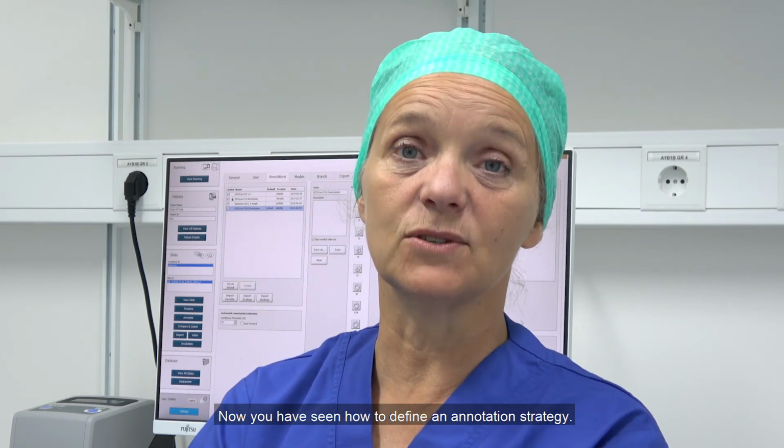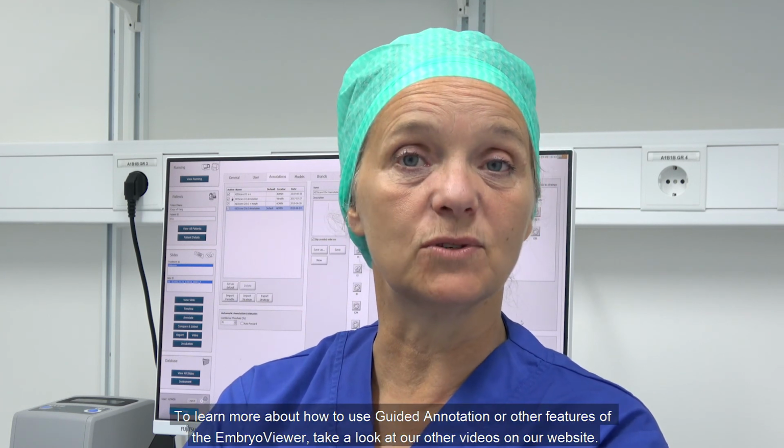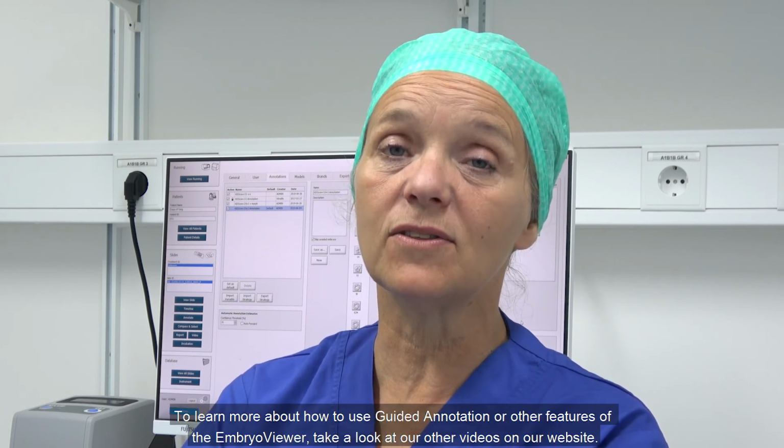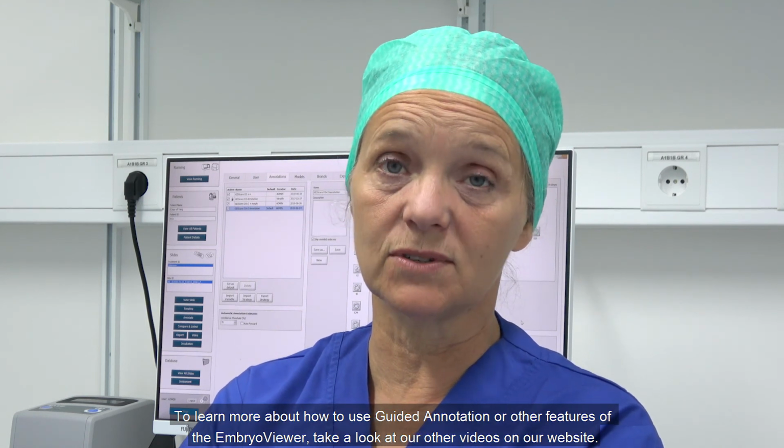Now you have seen how to define an annotation strategy. To learn more about how to use guided annotation or other features in the EmbryoViewer software, take a look at our other videos on our website.